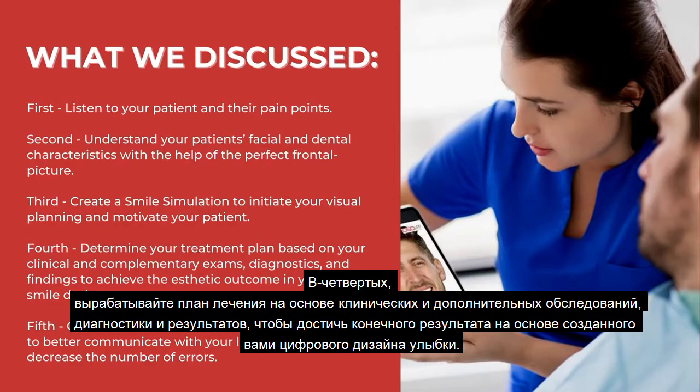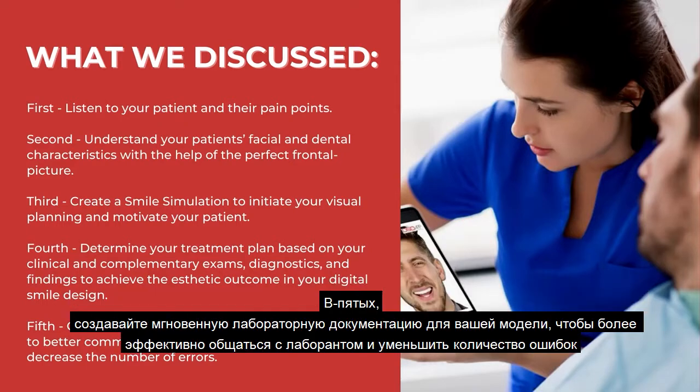Fourth, determine your treatment plan based on your clinical and complementary exams, diagnostics, and findings to achieve the goal of conquering the end result based on your digital smile design. And fifth, create instant lab documentation of your designs to better communicate with your lab technician and to decrease the number of errors using the DSDApp.